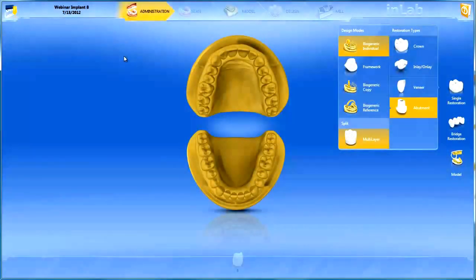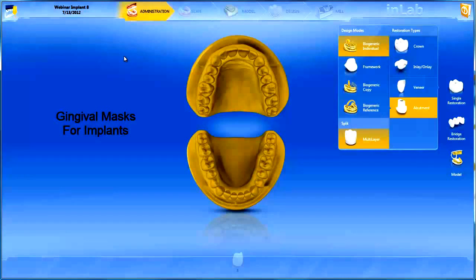Another subject I'd like to cover today is the usage of multiple catalogs in implants. I know it was covered previously in one of the webinars on 4.0 on the implants, and I know it was done in 3.8's webinar on implants, but I'm just going to go over a quick overview of the soft tissue for the implants, how to scan it in, and why we do it.